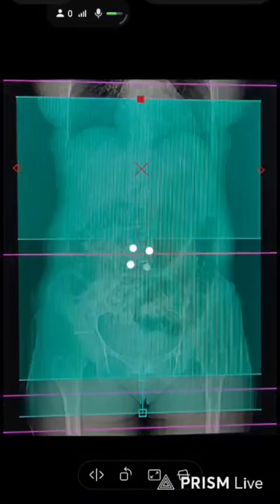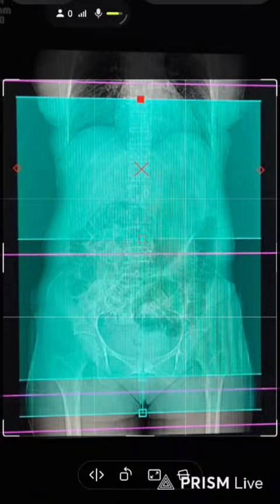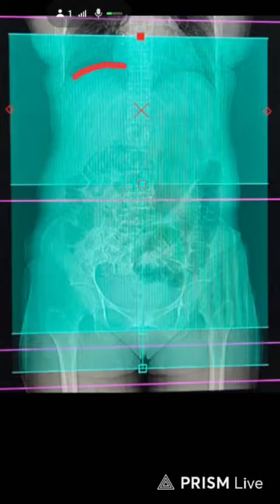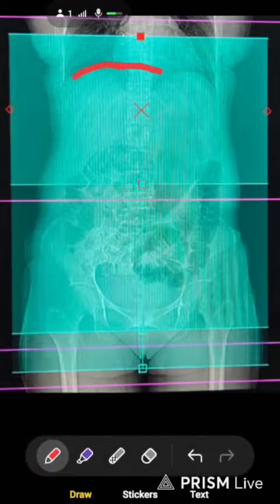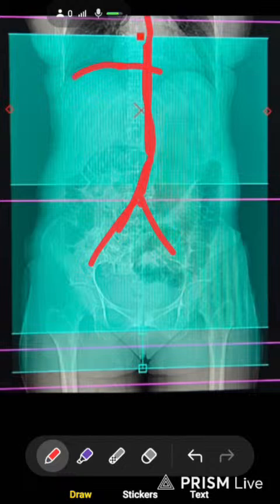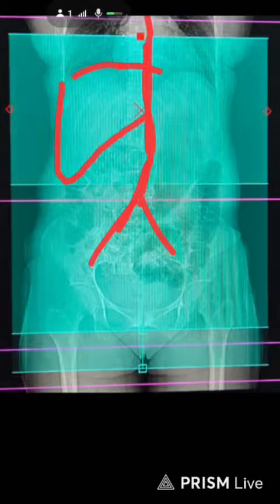This is the planning of an abdomen CT. Here you can see the liver. In the past scan, you don't identify whether the liver ends and the bifurcation location. So it will show you just an idea of the area. Here you can see how the liver looks in this area.